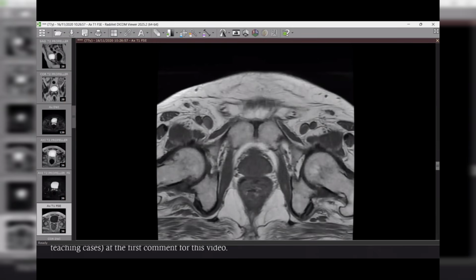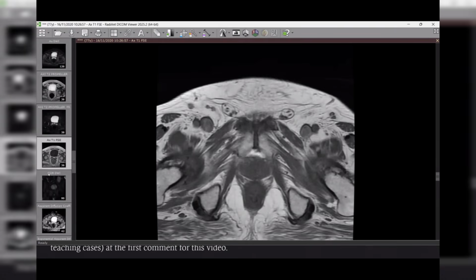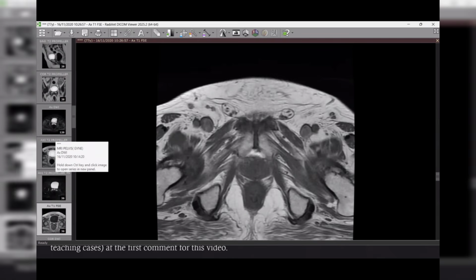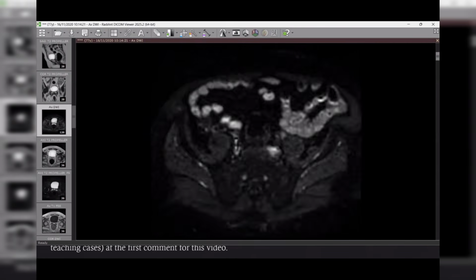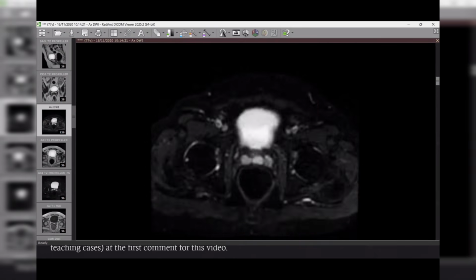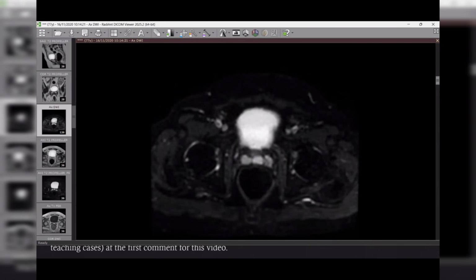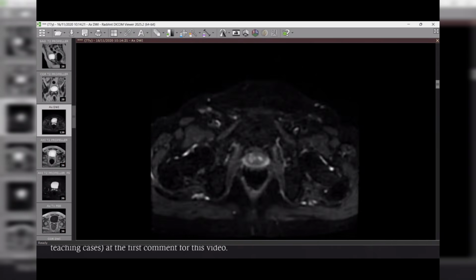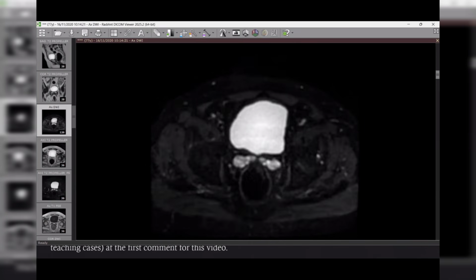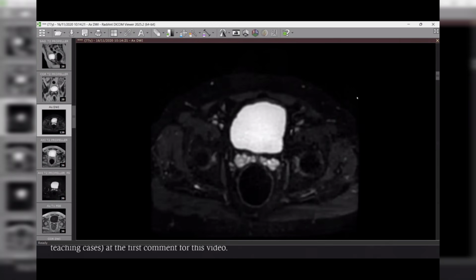Just a minute. I will give you just a minute. Can you please check the diffusion first? Okay, the T1 hyperintense area within the seminal vesicles also shows diffusion restriction. So these are the diffusion restriction images.